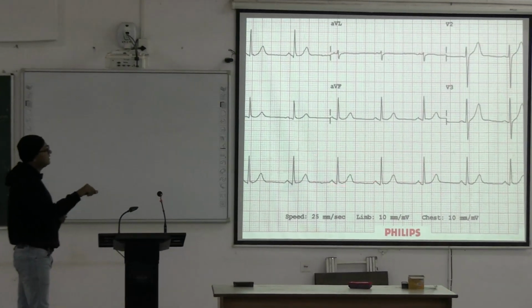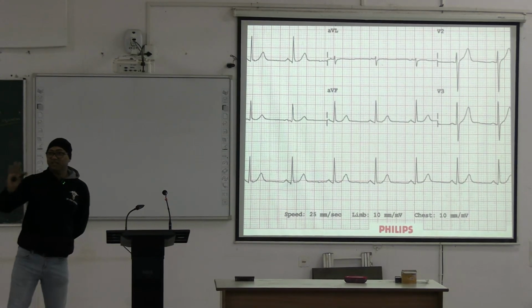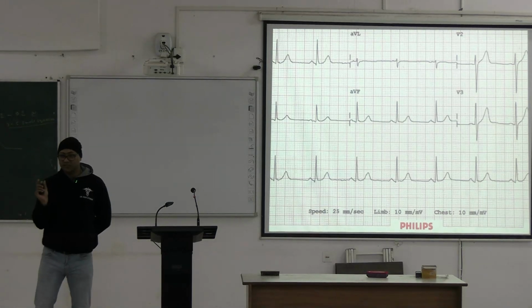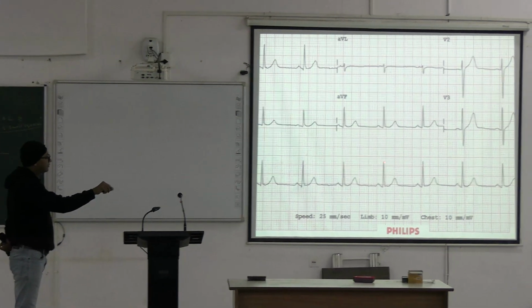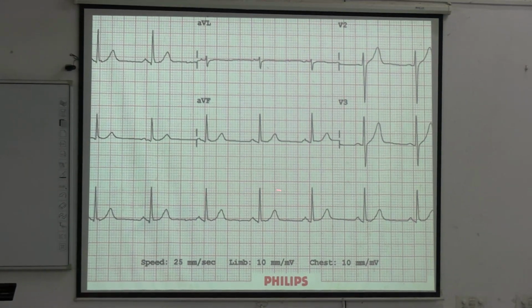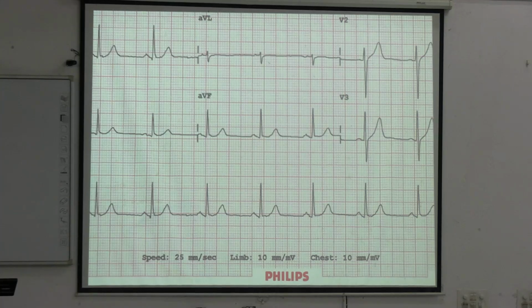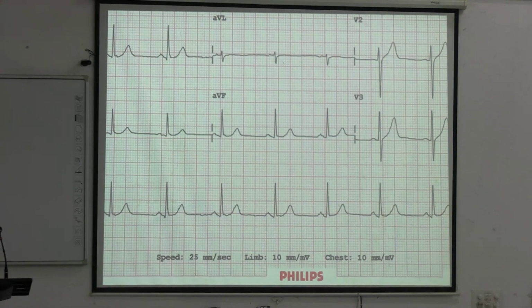Check here, it is lead 2, right? So, in lead 2, take any R subsequent, right? So, say for example, this R wave and this R wave, this R wave and this R wave. So, how many small squares are in between? Okay. So, this is 5, 5, 5, 15, 15, here 3, 18 and here 4, 22.